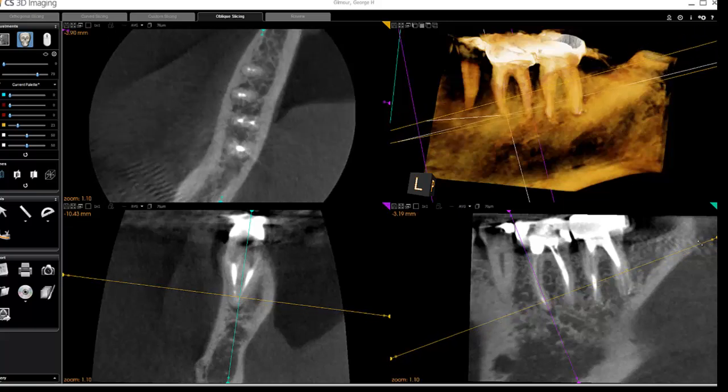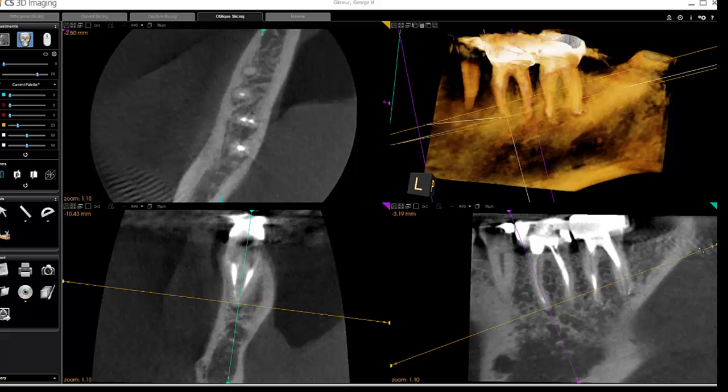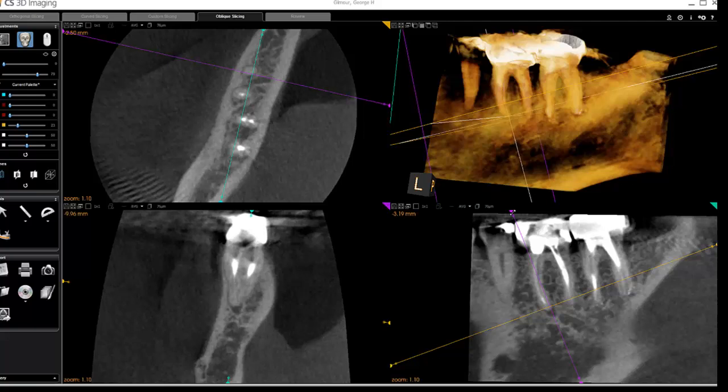They're not filled as densely at that area, and if they're not filled, you can also sometimes suspect at least that it probably wasn't cleaned or debrided, because what you don't clean, you often can't fill. So you can see there's absent material in the mesial root, and there's a resultant radiolucency, which you can presume is very likely a lesion of endodontic origin.